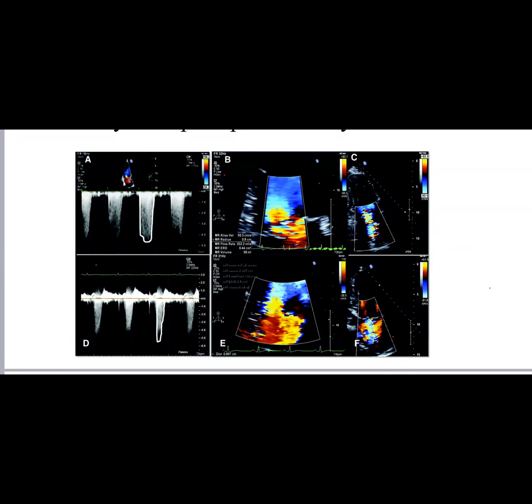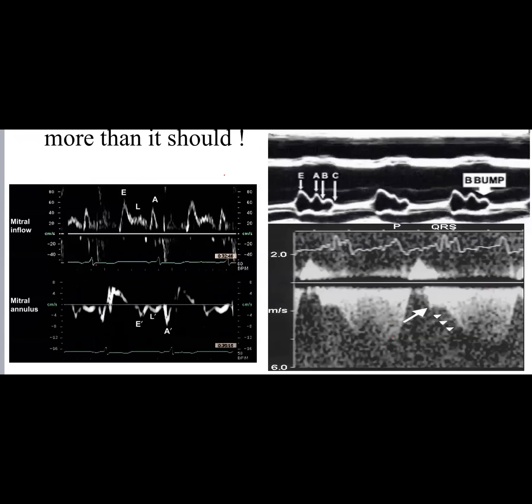Okay, remember that. Now you remember somebody talked initially about the mid-diastolic flow. And what does that mean? This is the mid-diastolic flow. You see the E and A, and in between there is L. They call it the L hump. Yes, the L hump. And I think one of you has actually said it right, it might be normal, okay? But it might also mean significant diastolic dysfunction.